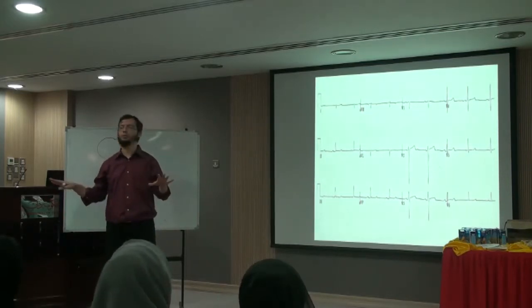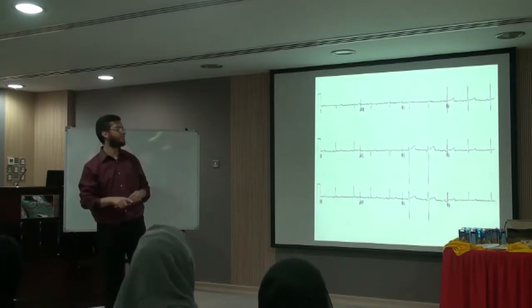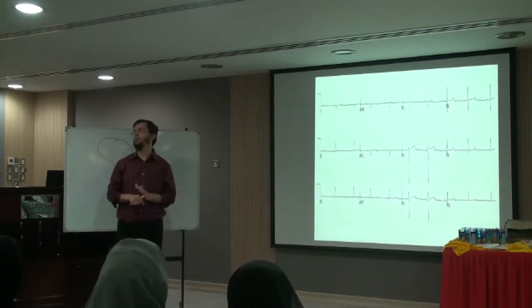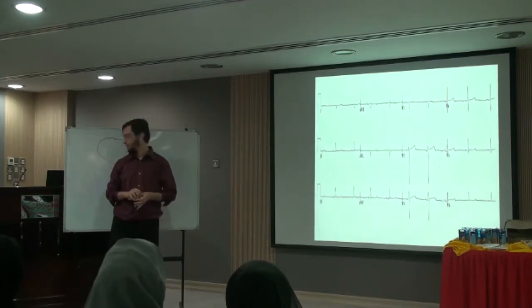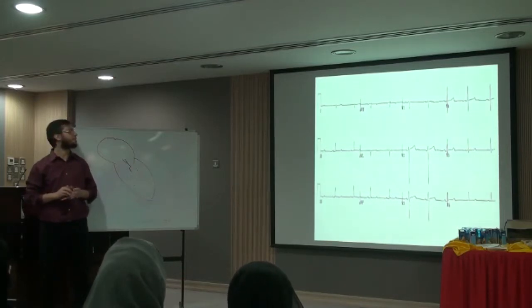There is no problem here with the AV node. Think outside this. QT? Okay, look at lead. What is the axis here? Axis, yeah. Right axis. Right axis deviation. Excellent.